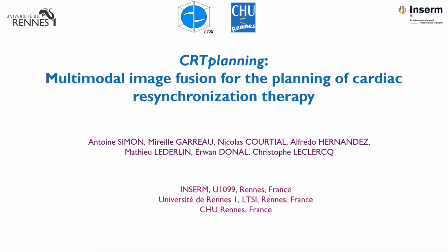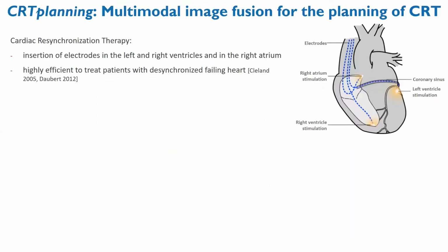CRT planning is a software for multimodal image fusion for the planning of cardiac resynchronization therapy. Cardiac resynchronization therapy, or CRT, is based on the insertion of electrodes in the right atrium, in the right ventricle, and in the left ventricle through a vein.